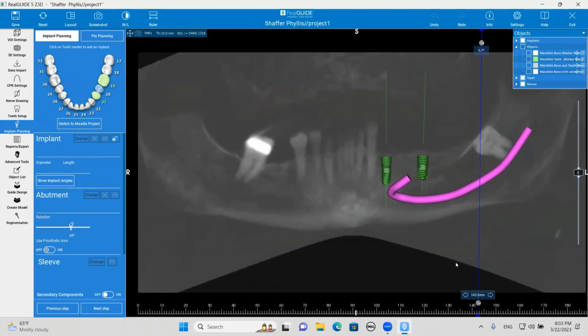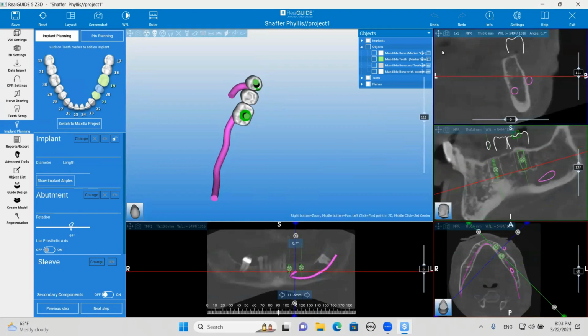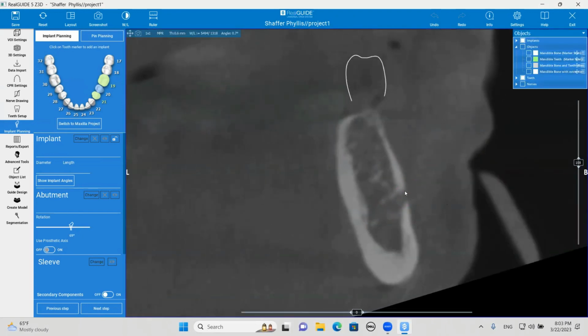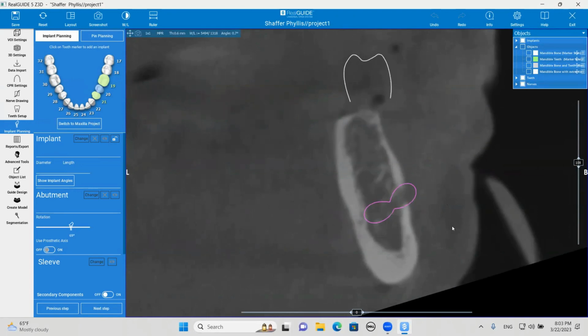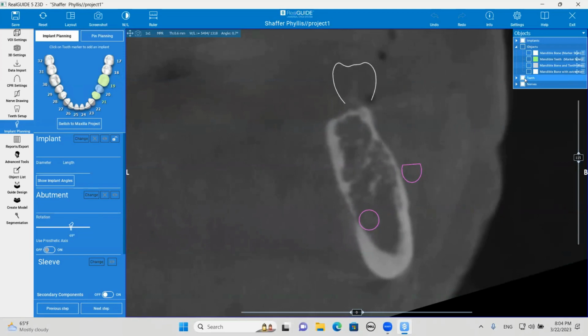They know where the nerve is coming in on the lingual surface by the lingula, and they know where it comes out. So they'll work in 2 directions, and then they'll connect the 2 points. So see where he can see just barely where the canal is, and then he knows where the nerve comes in, and then he can trace it image by image. It takes a long time to do, but they're very good. They're the best at it that I've seen.